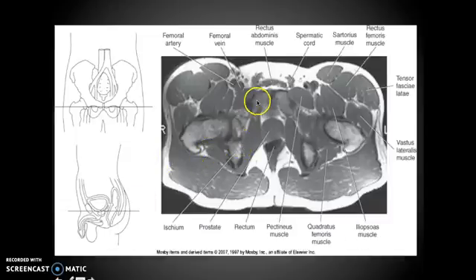All right, so looking, we're going to start over here. The femoral artery actually is more anterior than the vein, which is rare. Normally the artery is deeper within the body for protection, but this is the one place that is more anterior, which is great when we're doing a femoral stick. But when doing a hip injection, you've got to be careful.